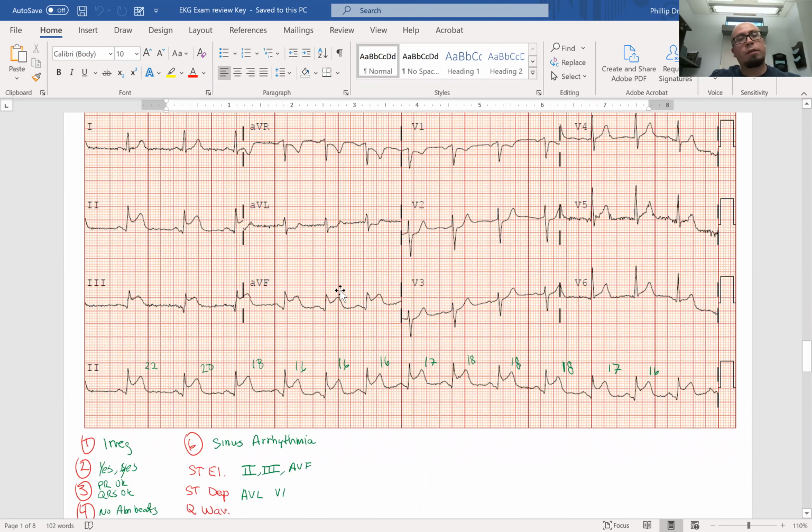So this is the technique I would recommend using on your exam. We have lead 2 all the way down here. Here's our 12 leads right here. You're still going to check for regularity for step 1. And when you're checking for regularity on this one, you're going to identify that it is irregular. So you take that into consideration, and you go to step 2.